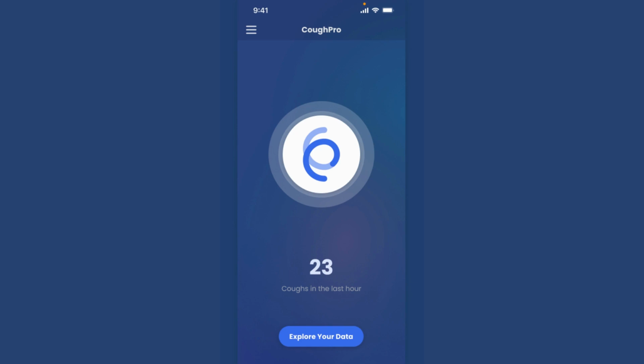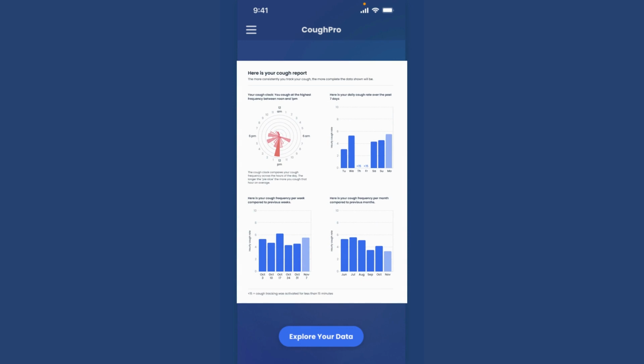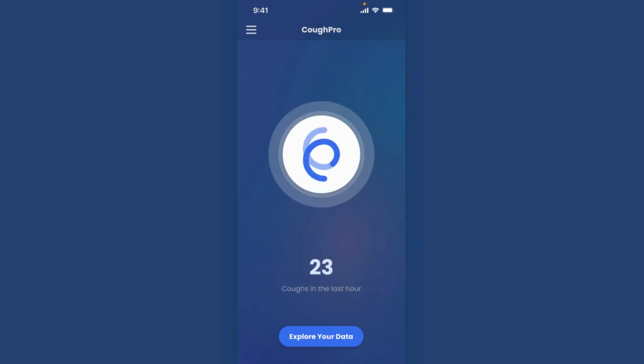Welcome to our video tutorial on the cough report of CoughPro. In this tutorial, we'll walk you through the cough report feature that will help you gain deeper insights into your cough patterns. Let's dive in.